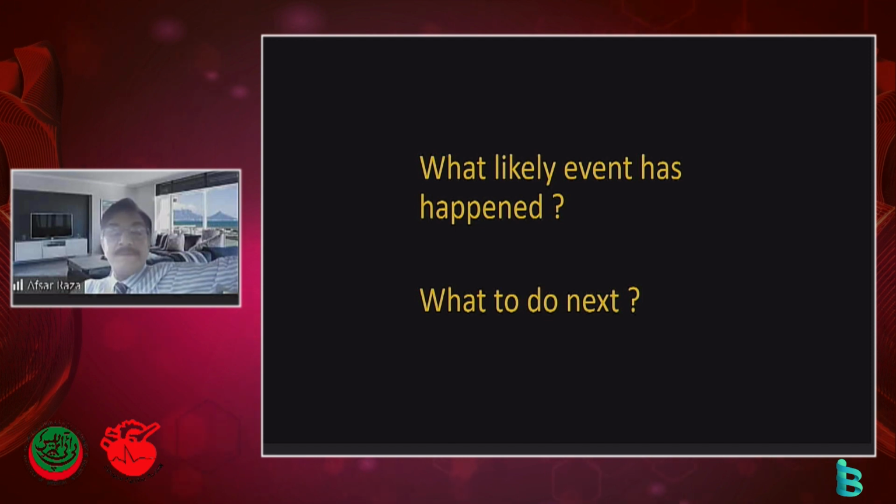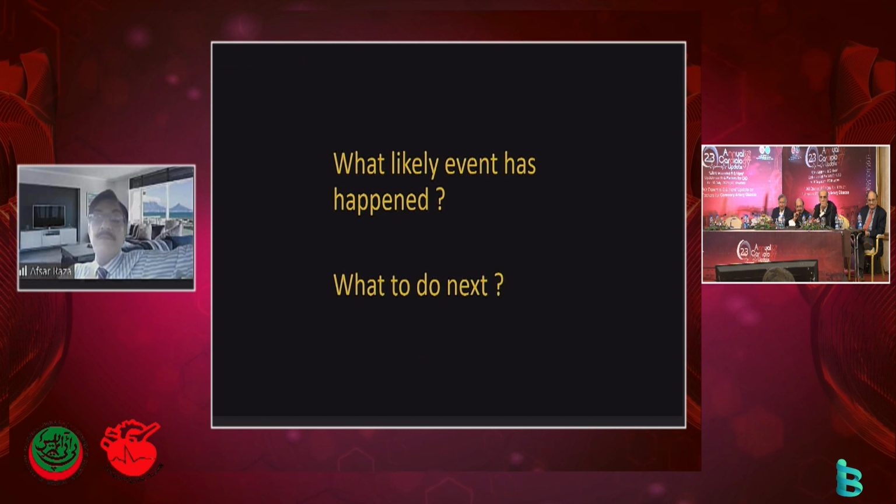Assalamu alaikum, Afsar. It's a great case. We've seen the left system. We haven't seen the right. Something might have shot down the right side, because I think the inferior leads showed some ST elevation of some sort.